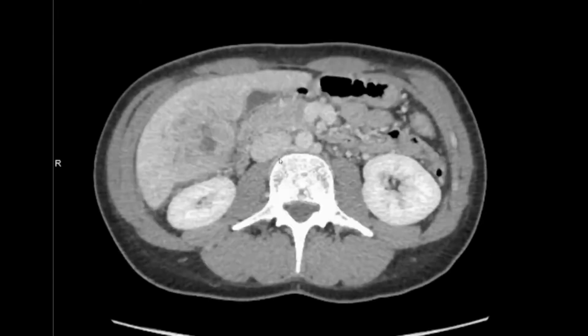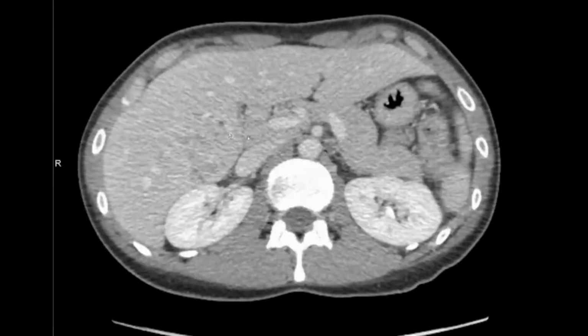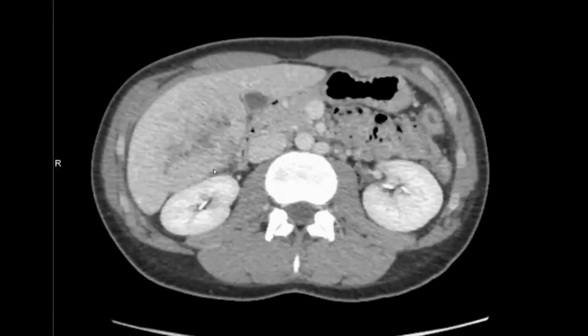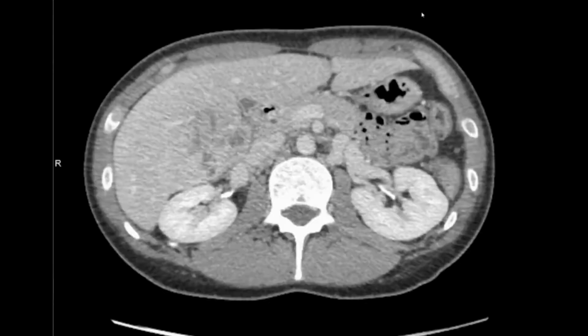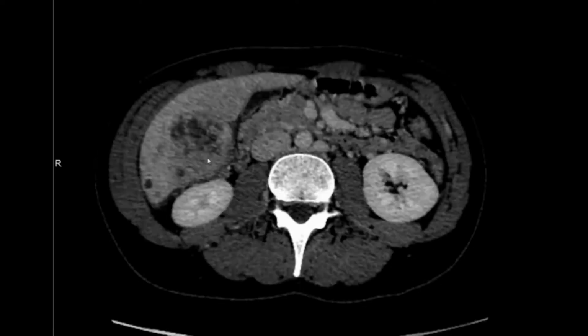Then I'm going to look at the portal venous phase, which is this. I can tell it is because the hepatic veins and the portal veins are opacified. You can window it kind of hard, window it as you see fit. On a general view, this is kind of hinting that there is washout, as you can compare this to this. But if you really window hard, the appropriate way that you see fit, then you'll see that there is absolutely washout on this lesion. We can confirm it by looking at background enhancement versus the washout appearance that we see here.